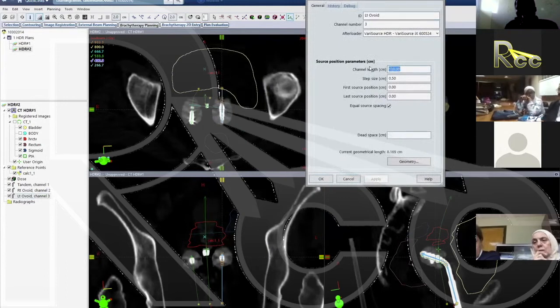One thing we would also want to be very careful of, and this is what we talked about last week, is that we like to do a measurement of the length once we have the transfer guide tubes connected. At our institution, we would actually go into the room, connect the transfer guide tubes, and then put a measurement wire all the way through each one of these catheters and measure the length. From that, we would be able to determine what this length was. At our institution, with our transfer guide tubes and our setup, it should always be 132 centimeters for tandems and ovoids.